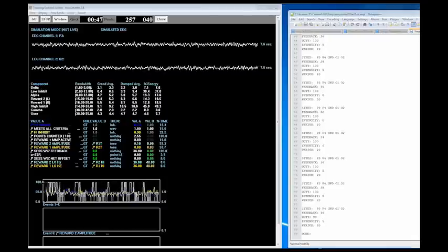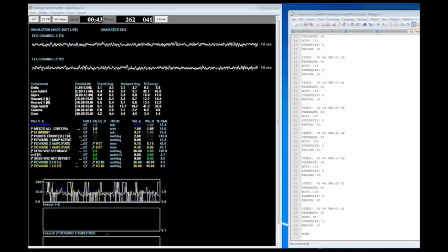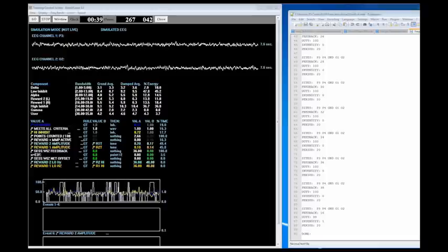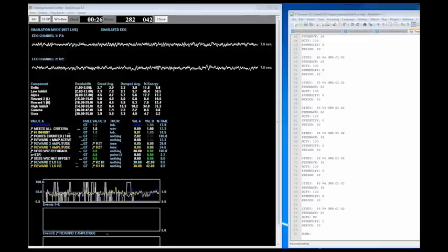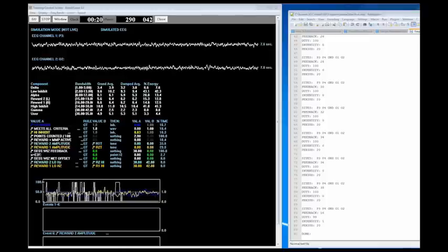There is actually something on the knowledge base. Tom, at one point in time, I believe, created a basic mini-Q format that went to different 4-channel hubs, you know, C3, C4, P3, P4, some of the different ones, and would work for 1, 2, 3, 4 minutes, and would do the training based on, of course, your Z-score training. That is the thing about the SessionWizard: you can load some of these different things to almost any training file ahead of time, and it will pretty much do that.